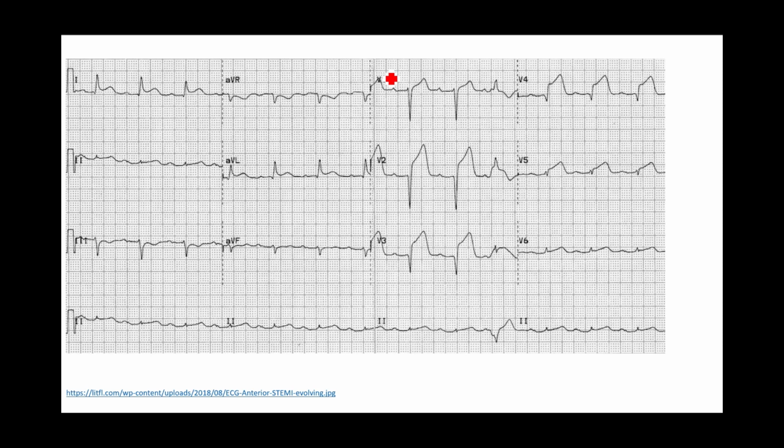The answer is yes. There's definitely an ST elevation in V1, V2, V3, V4, V5, maybe a little bit in V6, for sure a little bit in lead 1, as well as AVL. You may have also noticed the subtle ST depressions in AVR and lead 3.